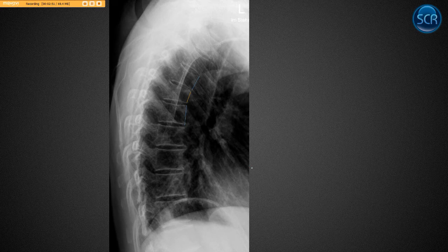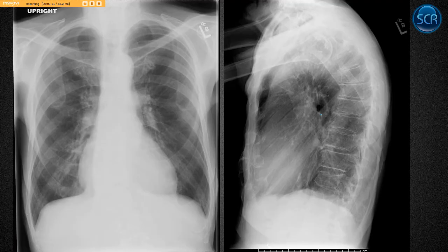Here's a case of thoracic spine compression fracture, and so this can be a bit subtle, so I've highlighted here the anterior vertebral body heights. You can see that this one's normal, and this one's normal, and this one is decreased by maybe 40%. So make sure you're going through in the thoracic spine and you're looking to see if there's any wedge vertebra, and don't necessarily look for the wedge. Look at the anterior vertebral body heights and see if there's one that stands out. So if we scan down here, we'd notice that this one's less, and then keep going, even though when we just glance at the vertebral body morphology itself, it may not be quite as obvious.